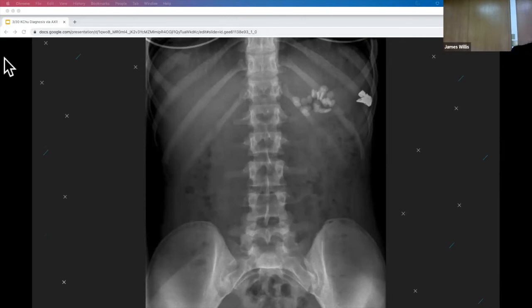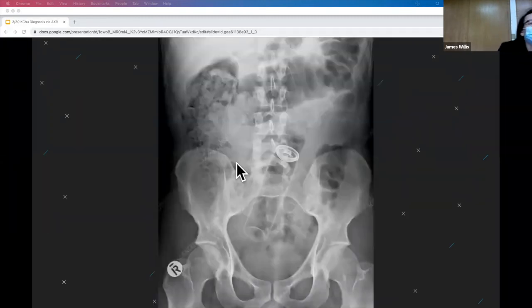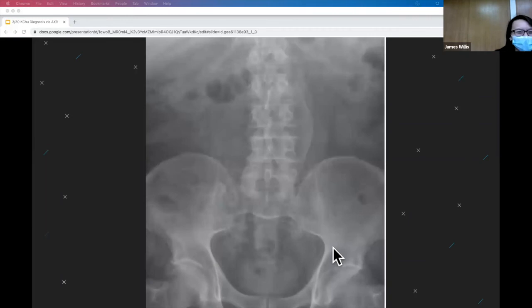Can you say a little louder? So the spleen's usually over here. It's actually in the stomach. Yes, these are iron pills. Thank you, Dr. Sinner. Great. Let's go back to the center. David. Yes, there's a deodorant can somewhere up the rectum. Correct. Okay, Taylor.